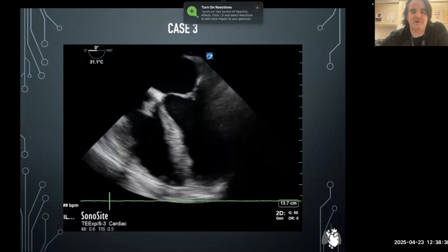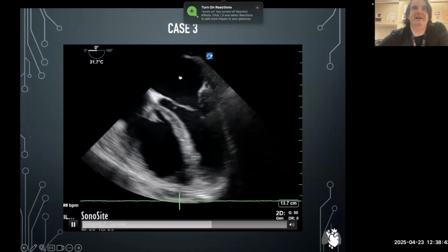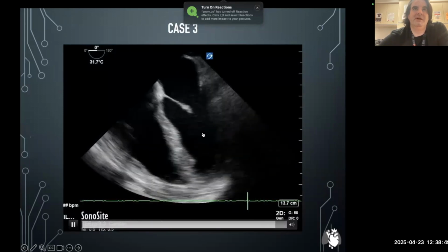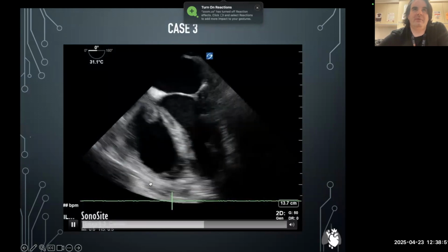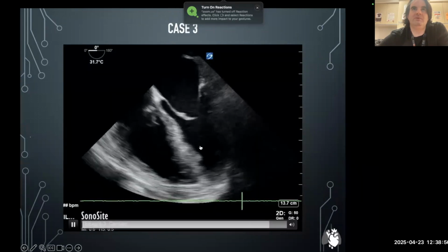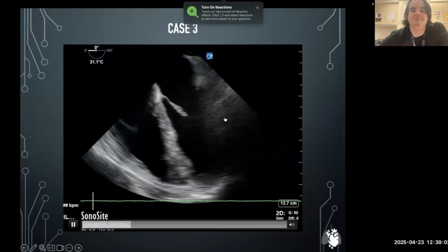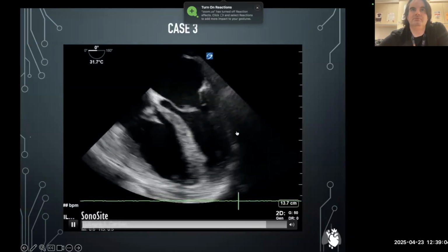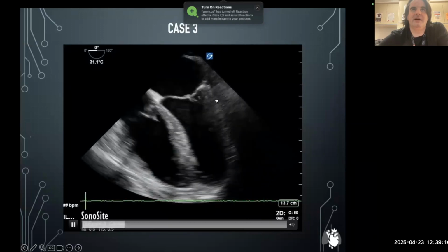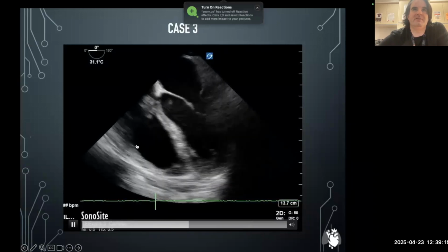TE, he had poor transthoracic windows. Again, plus he was in shock. This is our first view. This is called the mid-esophageal four chamber: left atrium, left ventricle, right atrium, right ventricle. And that's the pericardium, nothing much in the pericardium. The LV function here, what do we think? Normal, abnormal? It is a bit obscured, I'll admit, so you can't see it entirely here, but I'd probably think it's more on the normal side, to be honest. Yeah, the RV actually may be somewhat abnormal, to be honest.